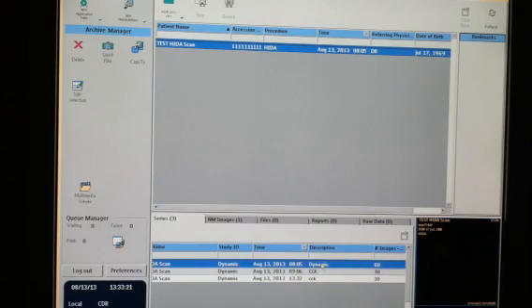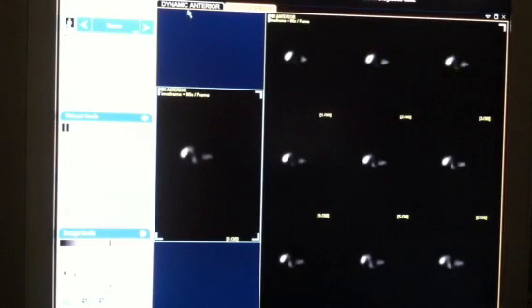minutes. So what we're going to do is we're going to pick both of these. So we're going to click on this one, hit Control, click on CCK, the large one, and we're going to come up here, and we're going to choose Application Suite. So that's going to bring both files up here. See, here's the first file, and here's the second file. What we want to do is we want to combine these two.